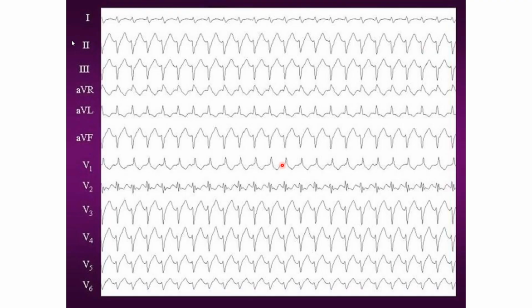Today we are starting off a new series of ECG discussions. First, we'll have some arrhythmias. One important wide QRS tachycardia will be discussed today. This ECG shows a wide QRS tachycardia. What is special about it?